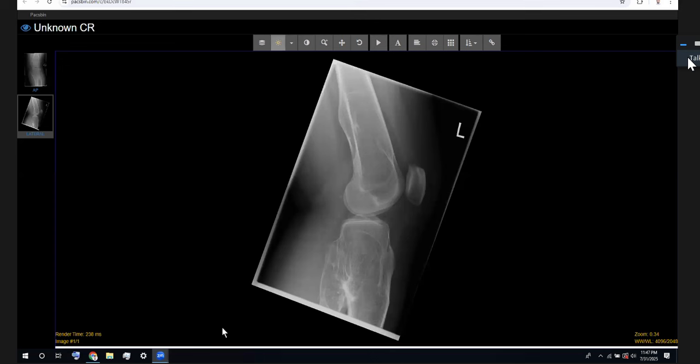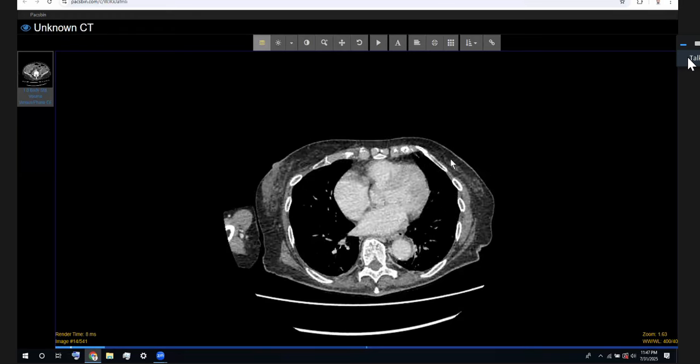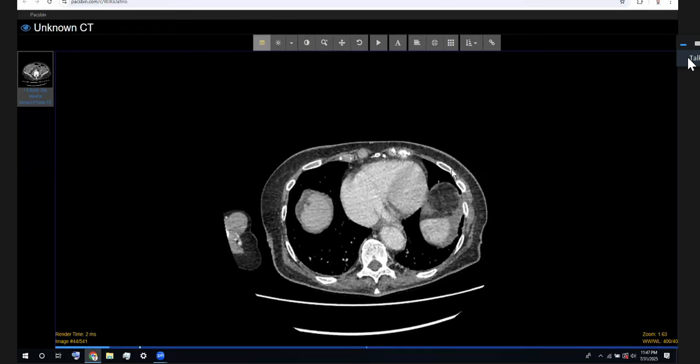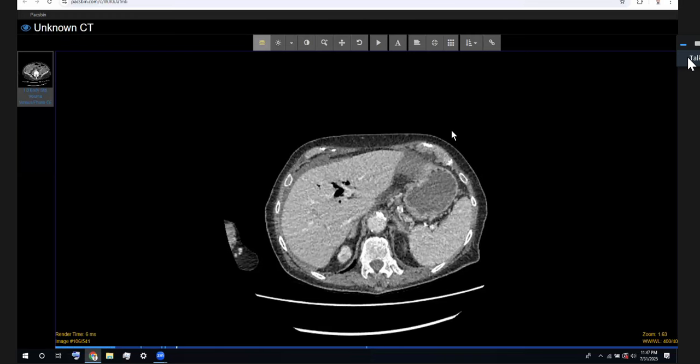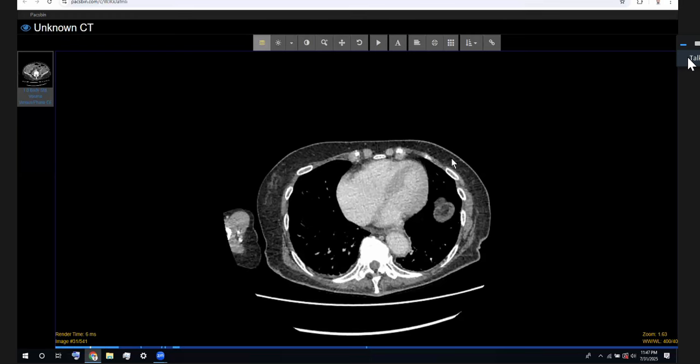Yeah. Perfect. Now, can you scroll? Go for it. Abdo pain. And sometimes you'll get something as vague as that in terms of your clinical history. It's just loading, just wait for it to load.